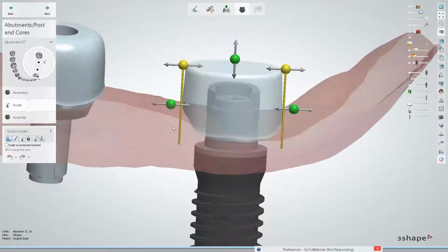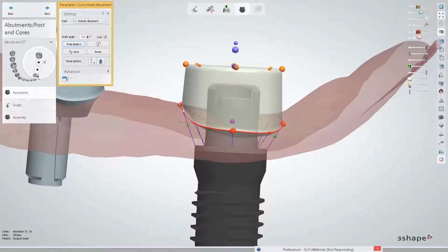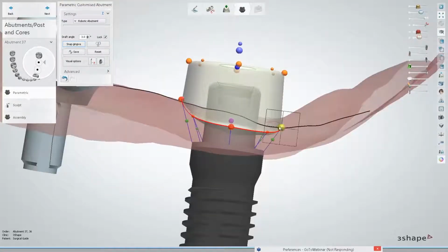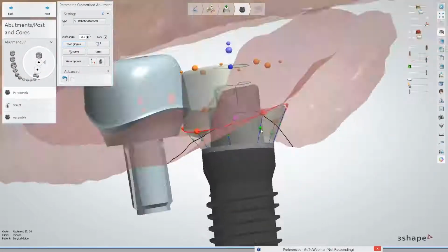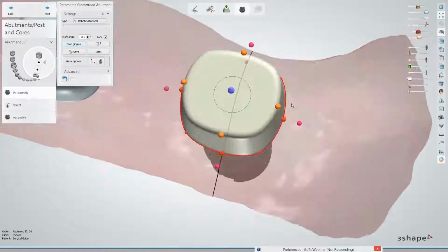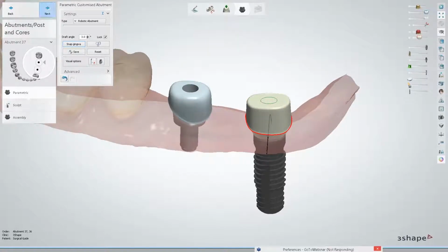As you can see, the design that I'm using in here allows me to do quite a lot of things. The functionality that I used is just a modification of the existing order form and adapting the current design possibilities to my needs.